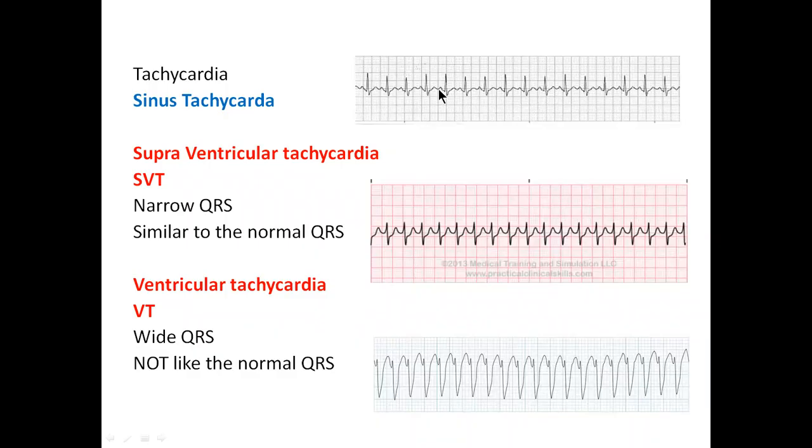You see a P wave, right? And then followed by the QRS. Now remember our rule, we always start with the rate. So we look at two QRS complexes. So 1 square would be 300 beats per minute and 2 squares will be 150 beats per minute. So this rhythm is going at 150 beats per minute. Next, we check the rhythm, right? Rate, rhythm. And you see that that's pretty regular. So far we know it's a tachycardia that's going at 150 beats per minute and it is regular.